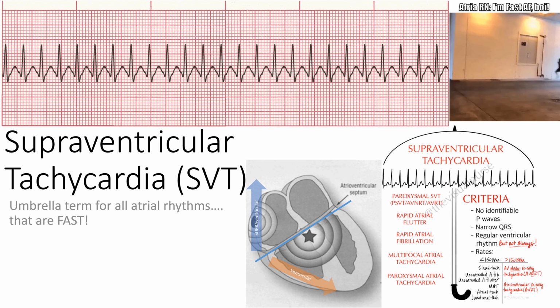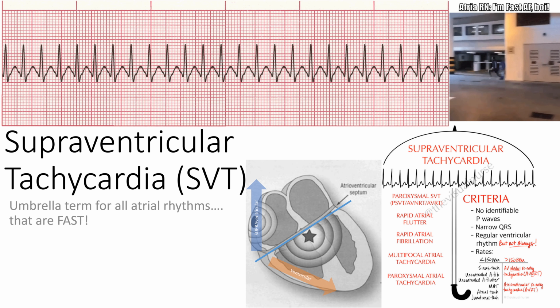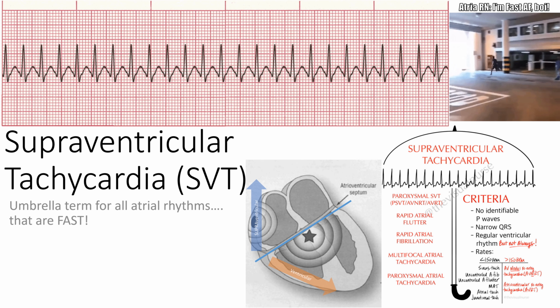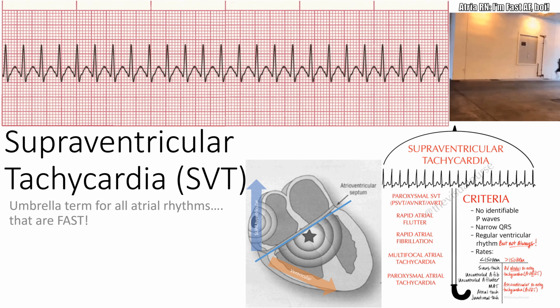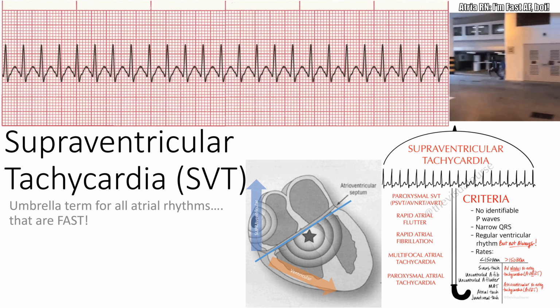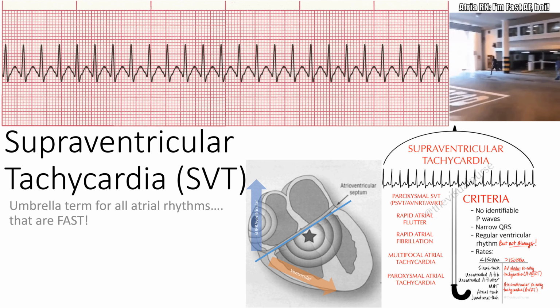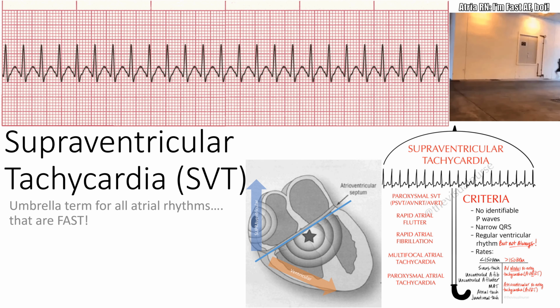All right, so supraventricular tachycardias. SVT and VT are two different things. SVT means it comes above the atrium, or supra to the ventricle. Supraventricular is above the ventricles, whereas ventricular tachycardia is the ventricles going way too fast, right? So ventricular tachycardias fall under our ventricular rhythms. VT is one of them, right? We're still up in atrial rhythms, and we're talking about SVT.